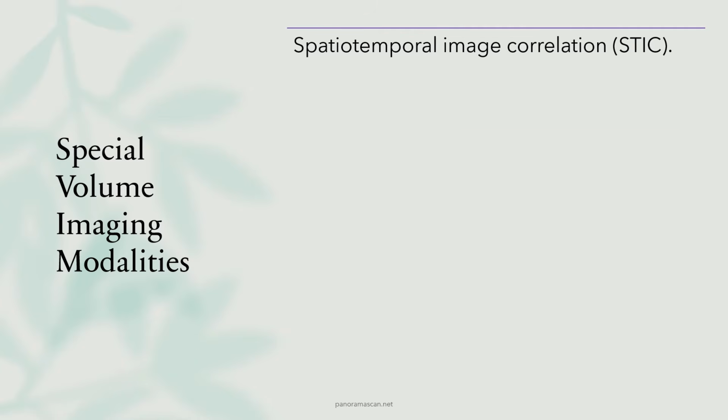Inversion mode enhances image visualization by inverting the grayscale, offering a greater contrast between tissues of varying echogenicity. This technique is especially useful for highlighting subtle anatomical features that might be harder to detect in standard imaging modes.